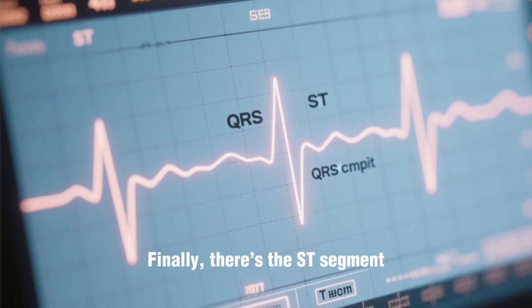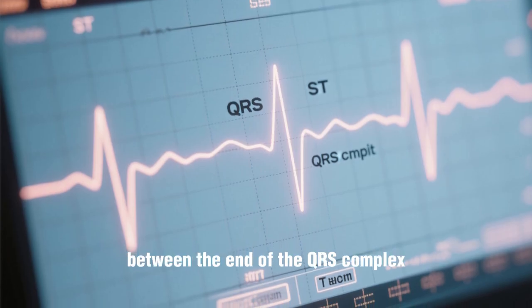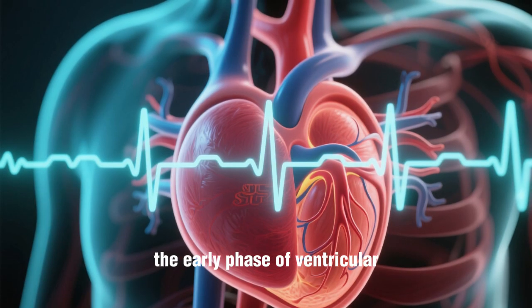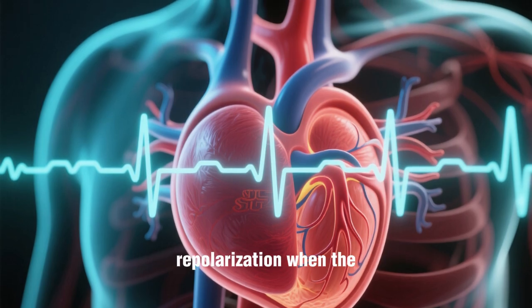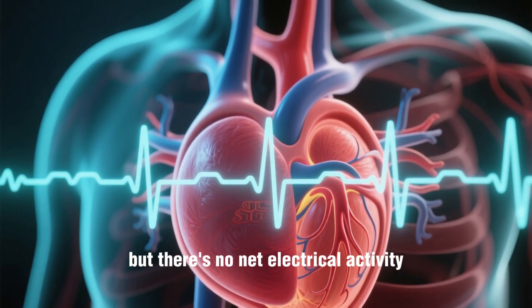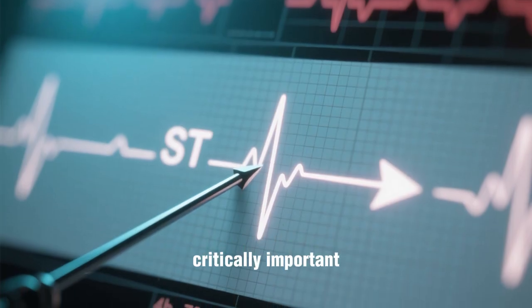Finally, there's the ST segment. This is the flat line between the end of the QRS complex and the beginning of the T wave. It represents the early phase of ventricular repolarization when the ventricles are contracting. But there's no net electrical activity. The position of the ST segment is critically important.